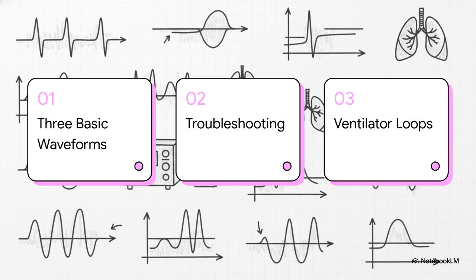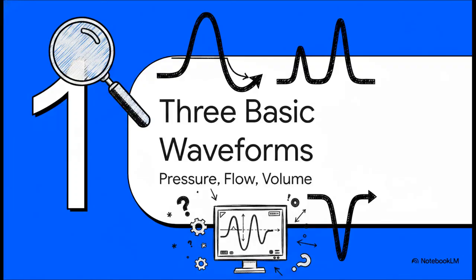Here's our agenda for today. First, we'll cover the 3 basic waveforms. Second, we'll get into troubleshooting common vent problems. And third, we'll finish up by decoding ventilator loops. All right, Part 1, the 3 basic waveforms.